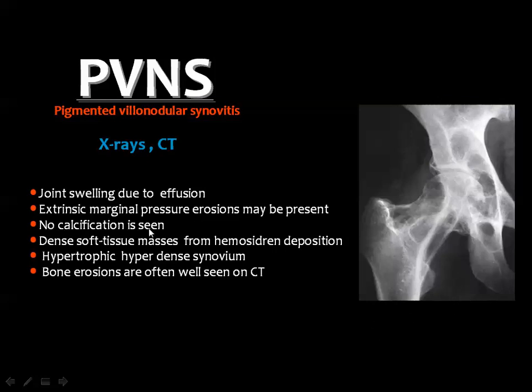The lesions do not contain calcium, and this is very important in the differential diagnosis.